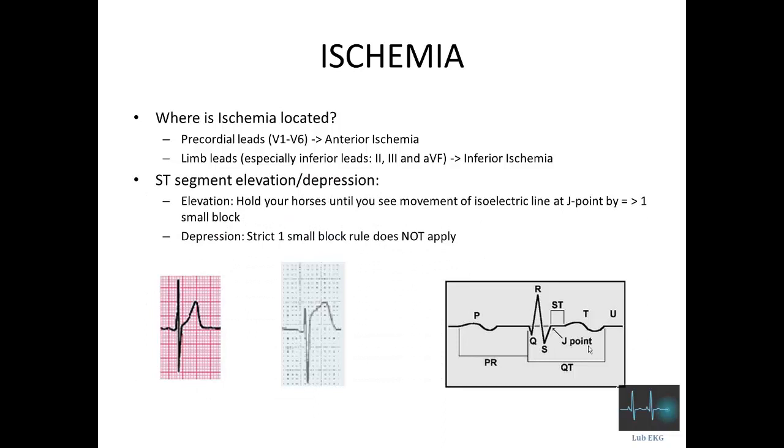Now, about ST segment elevation and depression. Remember, the J point here is what we look at. And just wait until you see movement of the isoelectric line at this J point by one small block in at least 2 leads before we sound the alarm, because ST segment elevations are a medical emergency.